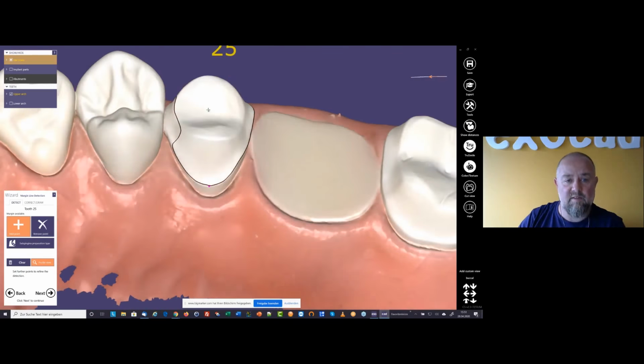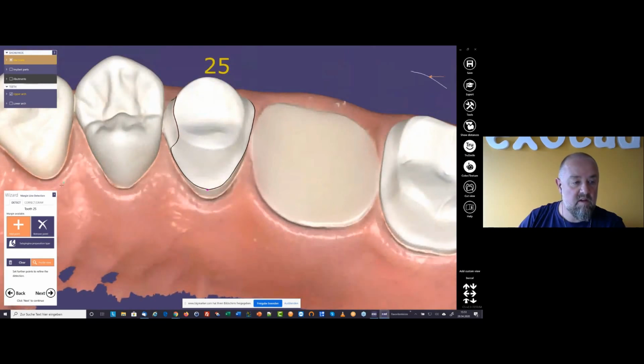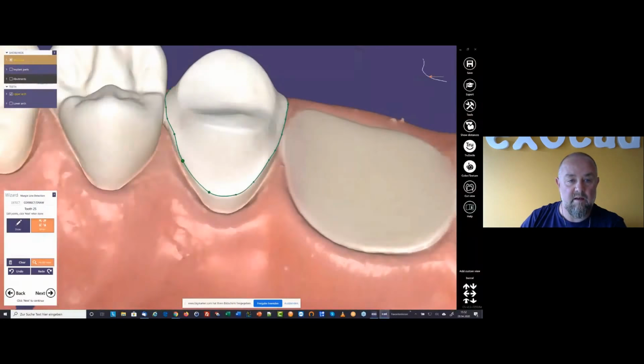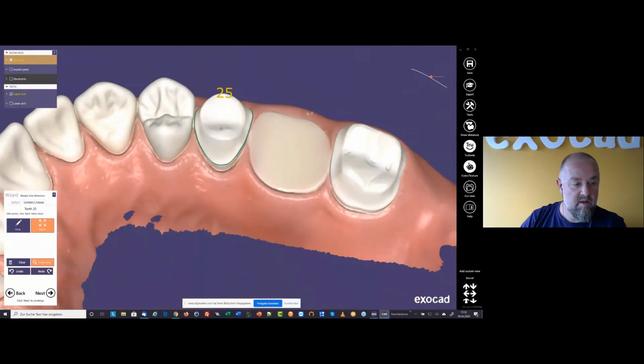So in any case, if the detection does not work correctly, you can, as I did, add additional points, or you simply go to the correct draw. And here you even have the ability, instead of just correcting the points, to draw part of the line. So this is the additional line in blue. With a double click, you finish. And then you have a new detection of your margin line here in this area.